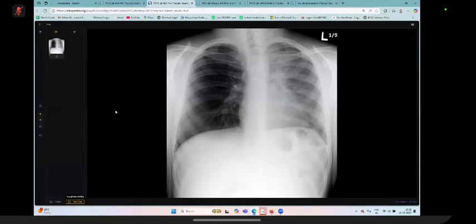If there have been past episodes as well, I would like to further see the previous imaging, whether this was the same or not. Other possibilities include that it could be some mucus plugging after a recent episode of pneumonia, or it could be due to any small interrupted pulmonary artery. The pectoralis muscles on both sides are normal, so that doesn't look like the case here.